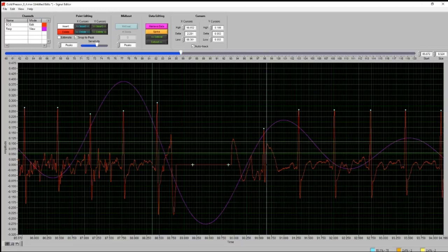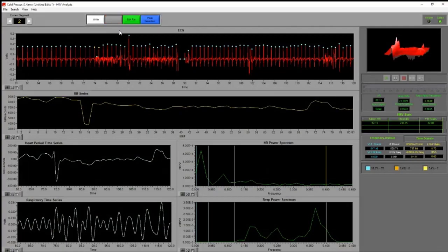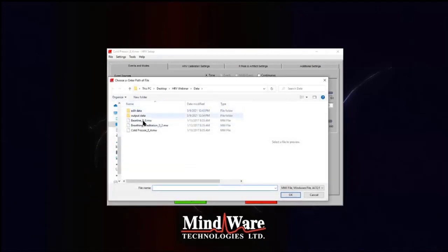Yeah, so the next question is, sometimes there is an R peak at the very end of a segment, and the question is, should I mark that or not? And I believe one of these files actually shows that, but I could be wrong here.